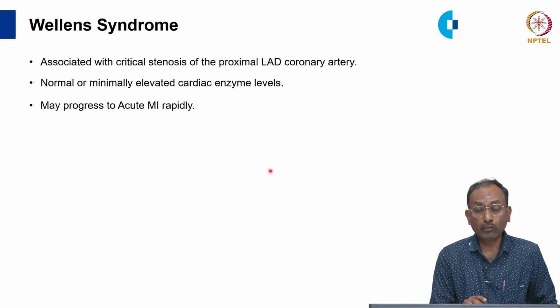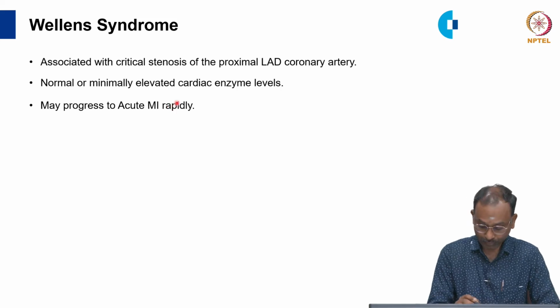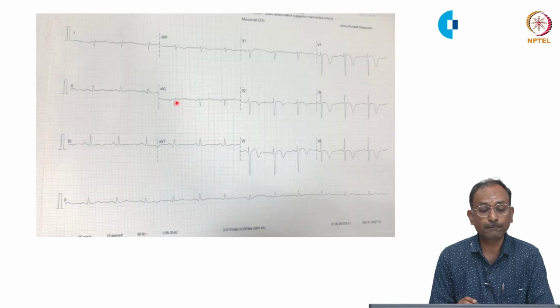So, Wellens syndrome, why is it very important? Because it is associated with critical stenosis of the proximal LAD coronary artery, with normal or minimally elevated cardiac enzymes. The most important aspect is that it may progress to acute myocardial infarction very rapidly. So, identification and management of Wellens syndrome is very important.